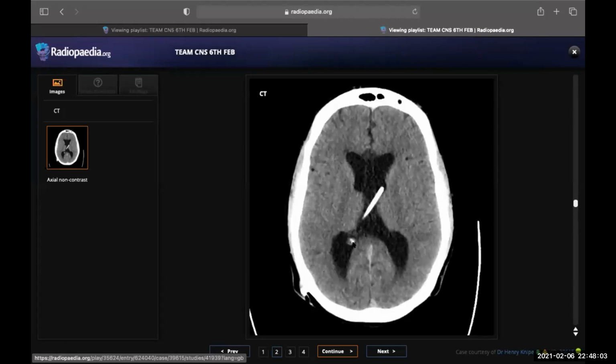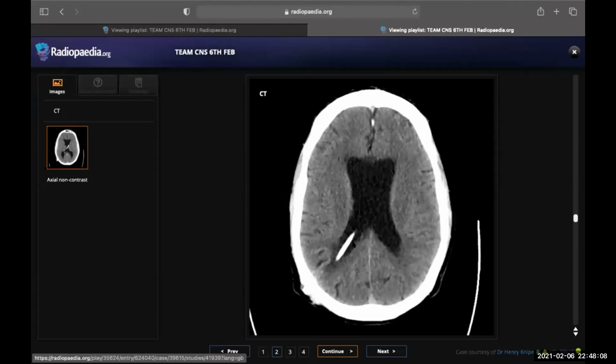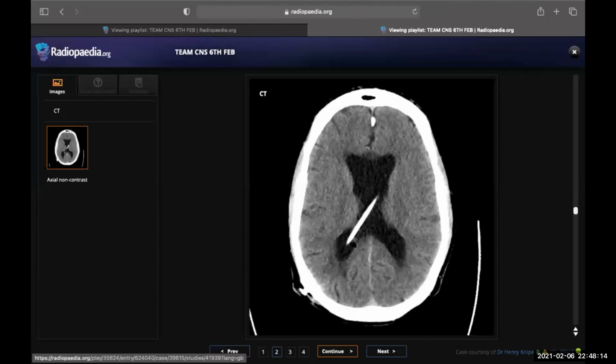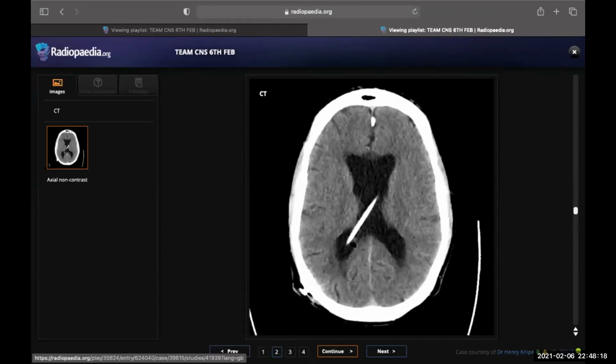So the VP shunt is not working, right? I will ask him to examine the patient. No, you know the clinicians. He wants you to do all the work. I want to see the other coronal and cervical. It's the same as the brain. What else will you do apart from CT brain?